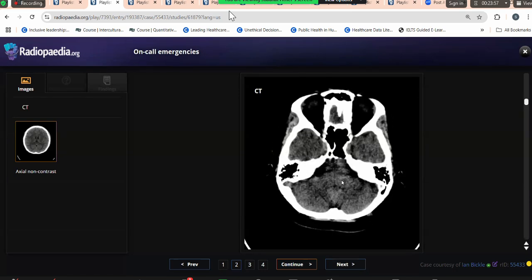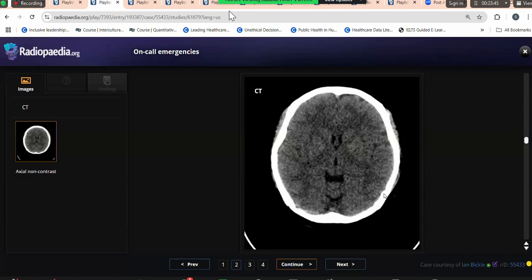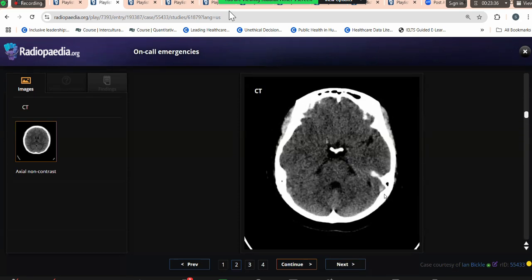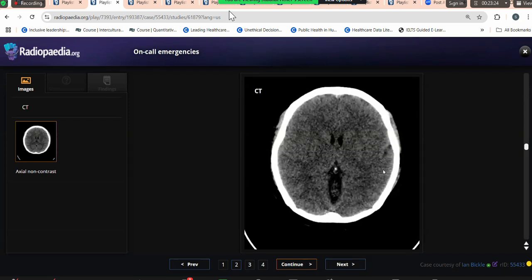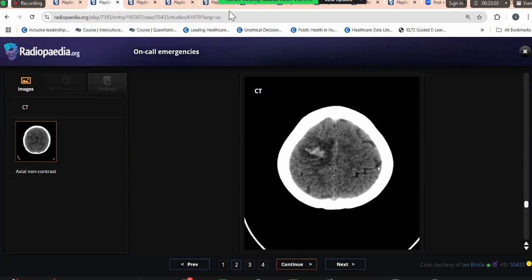Next, I would be looking at the dural venous sinuses, as this may represent a venous infarct or hemorrhage. So there is a hyperdensity noted within the left sigmoid sinus, and possibly the right transverse sinus as well. So I would alert the referring physician and would suggest an MRV to further assess this patient. Candidate 4, can you just go to the images where you showed me the positive findings, please? I'm at the top of the scan, this one. That's fine. Leave the cursor for a second.